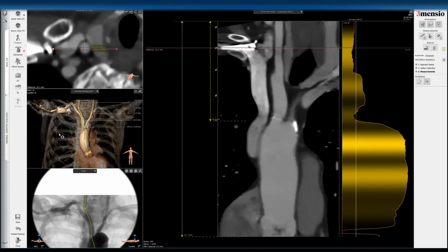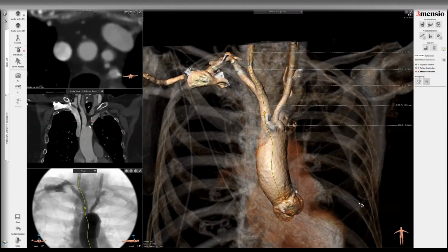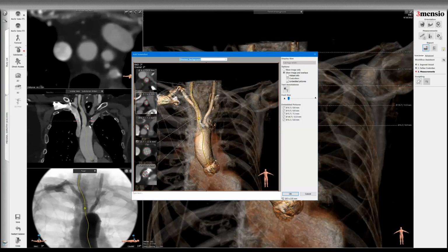Once you're done, you're going to put it in the report. I'm going to put this in first because I want to show the contour and the AP view. What I'll do next is save these images. I start with this 3D view on an AP dimension. You can see that it nicely lays out all the segmentations of the vessel size and diameter.